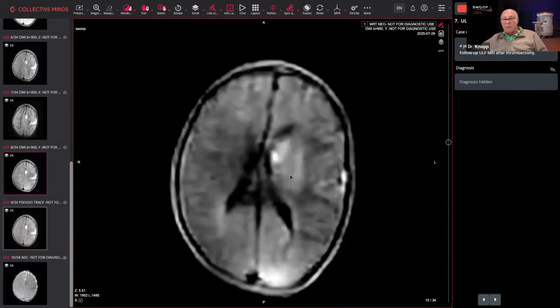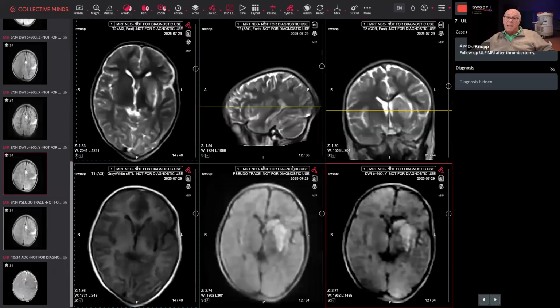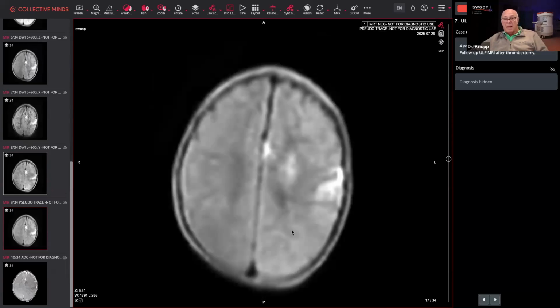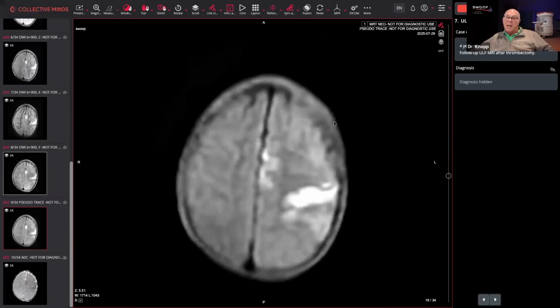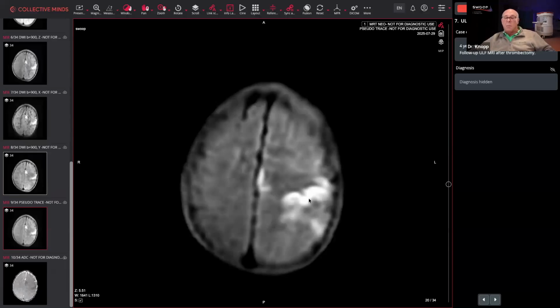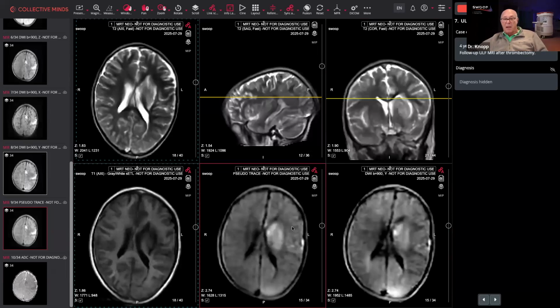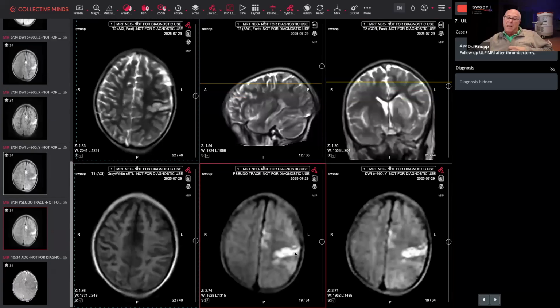And then we have this area of diffusion abnormality as well in that deep area that may be hemorrhage in my mind. In addition, Professor Sabir has the ability and has some fancier sequences, and this is what we call a trace image. This diffusion sequence is more analogous to what we see at high field. It's coming down the road in new software updates, but it gives us a cleaner image when we compare side by side the two images, showing basically the same thing, but in my mind, it increases our diagnostic confidence.